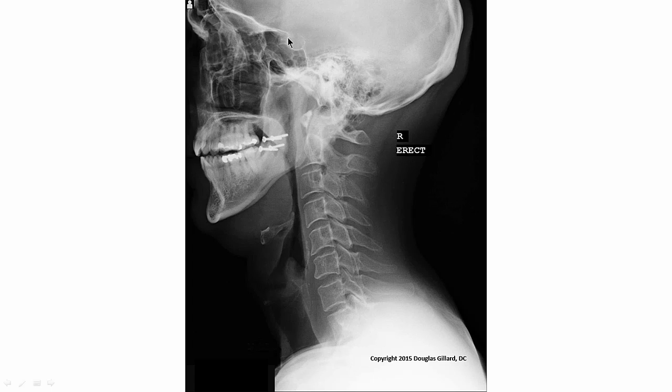You should know what this is as well. This is for the pituitary gland. See this little cave? That's called the sella turcica. Sella turcica. Let's continue. Body of C3. Now I didn't mark these, but these are fair game. See these little areas of increased bone density here? Here's a better one. Those are the transverse processes superimposed upon each other. Okay, so transverse process, these are all the bodies. So here's the inferior end plate, superior end plate of which number? Well, here's 2, here's 3, here's 4, so it's C4.